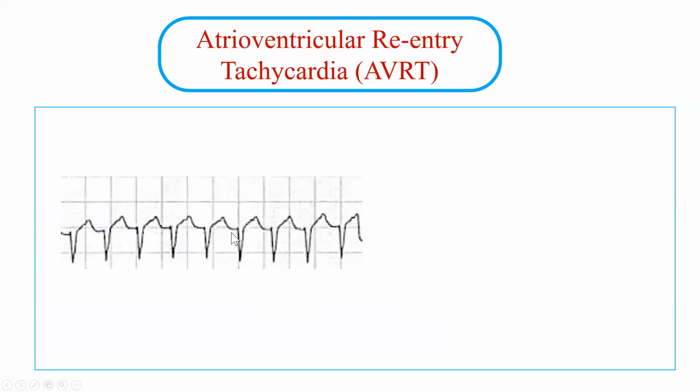Okay, let's take an example. Let's look at this EKG. It seems pretty regular, only one large square in between. And it's narrow complex. Again, narrow complex versus wide complex does not affect the management a lot because, again, if the patient is having bundle branch block, the QRS complex will be by definition wide complex. So this is a narrow complex tachycardia that is regular, and the heart rate is almost 300, a little bit less than 300, right?